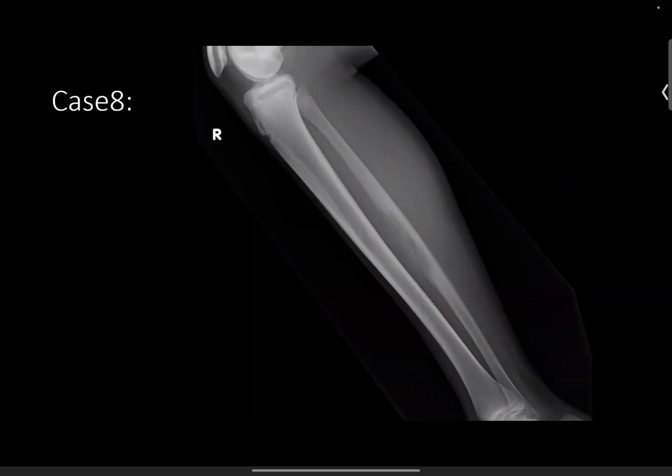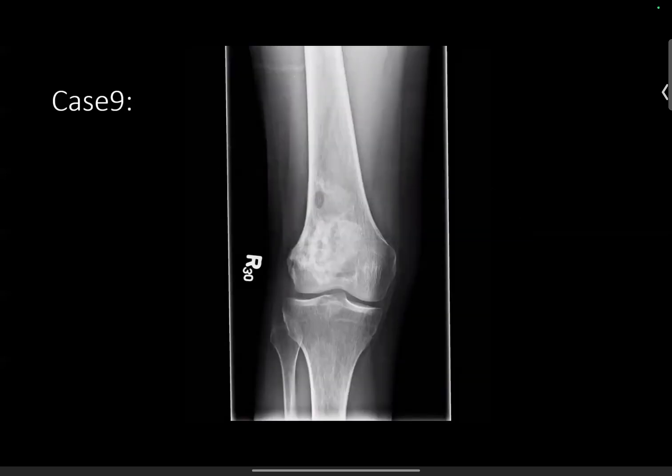This was a patient with dull pain for about 2 months. What we're seeing here is a lucent lesion with ill-defined margins, very ill-defined margins. So you should say to yourself, this is a malignant appearing lesion. And then when you say, where is it? It's in the diaphysis. You want to say Ewing sarcoma. So this was, unfortunately, a Ewing sarcoma.